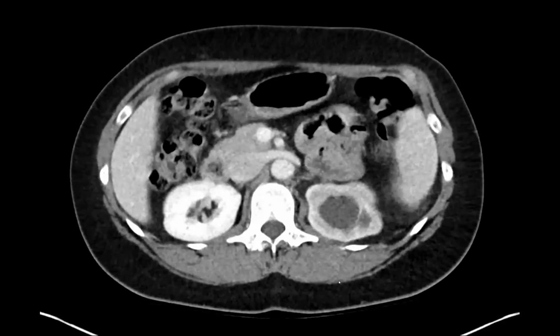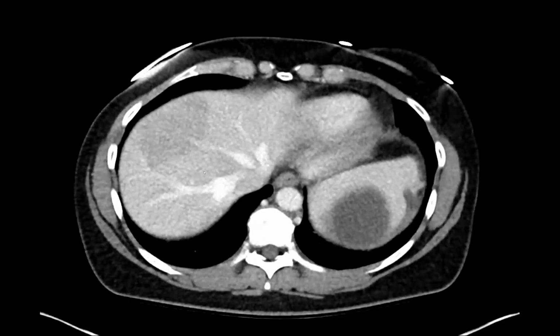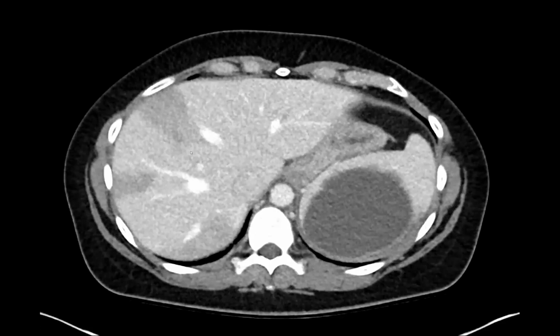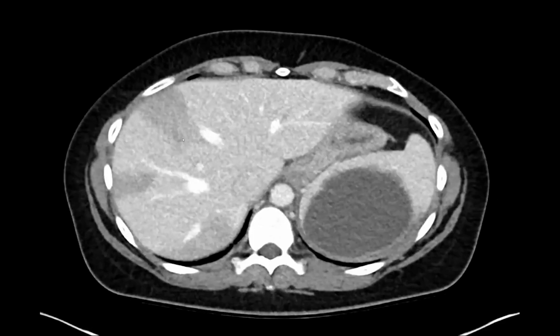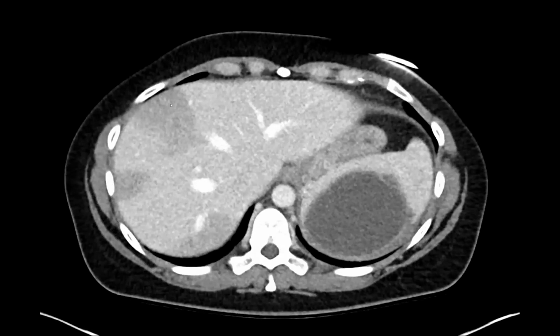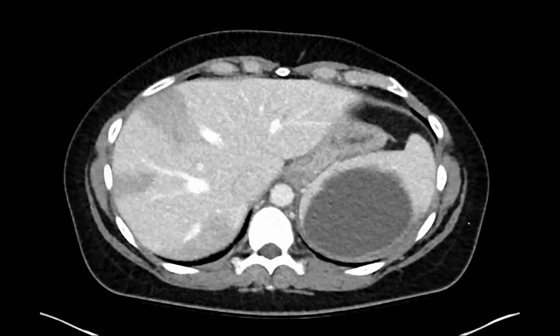How about the liver lesions? Yeah, and the liver, great. In the liver, we didn't know what was going on. It looked like perfusional abnormalities, wedge-shaped, peripheral. But anytime you have a malignancy, if you see new perfusional abnormalities, you should go to the apex of the perfusion abnormality and see if there's a metastatic lesion there that might be taking out the portal venule. In this case, this isn't an arterial buffer response. This is actually decreased perfusion. But let's just ignore the liver for now.